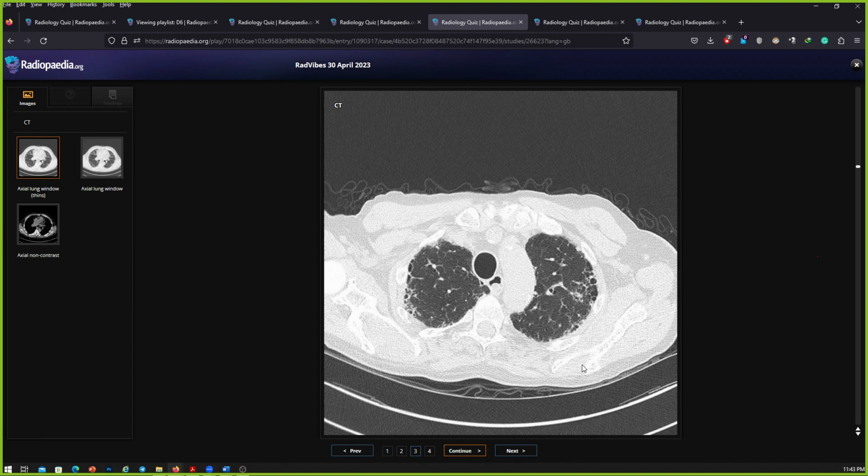Like I would ask if the patient has previous history of rheumatoid arthritis, or if there is a chronic drug exposure, or there is some occupational exposure, or any previous history of hypersensitivity, chronic hypersensitivity pneumonitis. So all these, I will have to rule out all the multiple causes for this possible UIP.